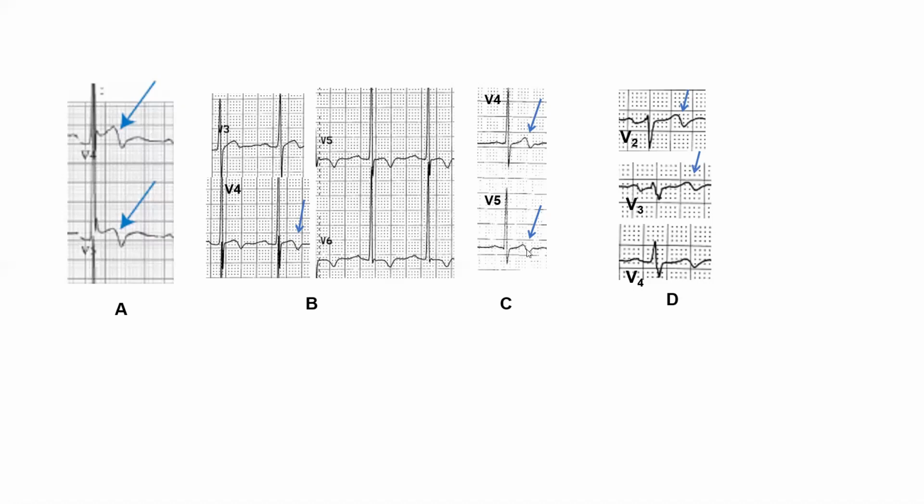It's not a very sharp downslope, and it's only in V4, V5. It's not V2, V3. This patient has been cathed 3 times because of that EKG at various institutions. Whenever they see this, they call it Wellens, they cath him. He does not have CAD. His troponin was undetectable. This is just a normal variant T wave in the lateral precordial leads.